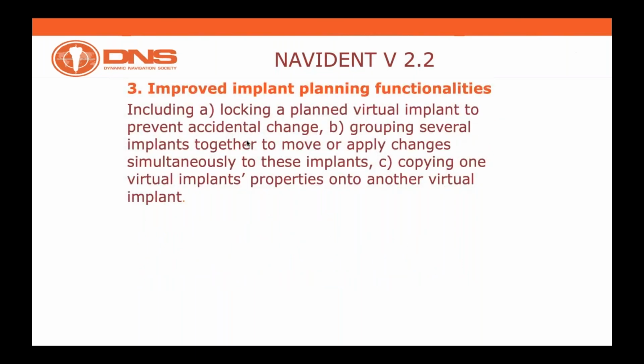Then I will talk about some improved implant planning functionalities. We will talk about locking a planned virtual implant in order to prevent any accidental change.